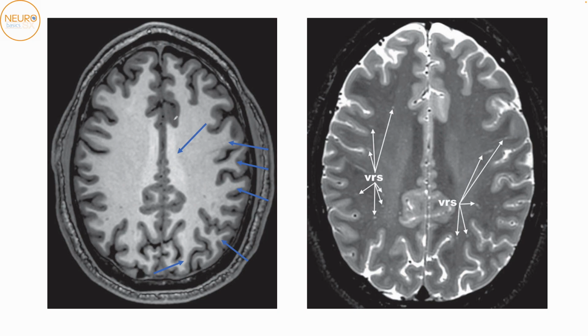again, we have the superior frontal gyrus and the middle frontal gyrus. We have not yet reached the inferior frontal gyrus. Using the thick thin sign, we are able to identify that this is the precentral gyrus and this is the postcentral gyrus. Behind the postcentral gyrus, we'll again have the supramarginal gyrus and the angular gyrus.